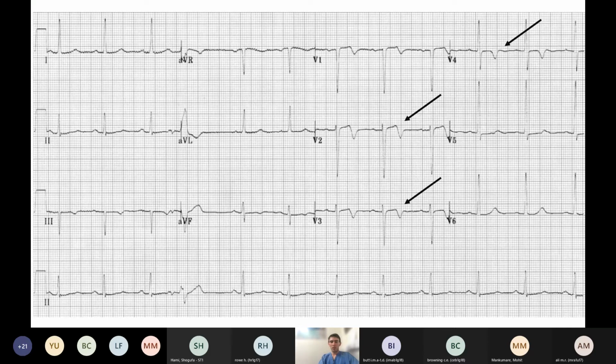You have to appreciate that none of these anatomical rules are particularly 100%. And the diagrams we use are, of course, 2D, and you have to think of the heart as a 3D structure. So actually, some of the depolarization and repolarization doesn't occur perfectly along the same axis. V2, V3, and V4 would normally have an upright T wave, and here they are down.